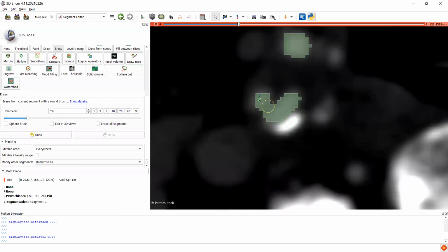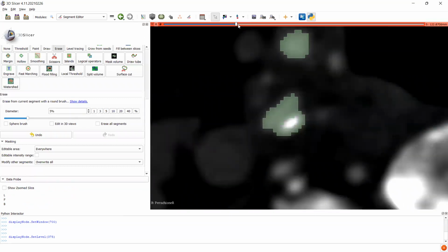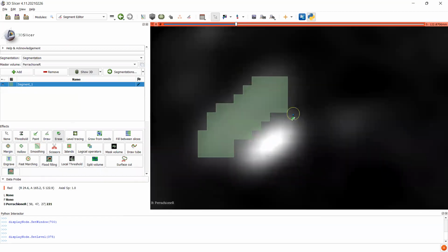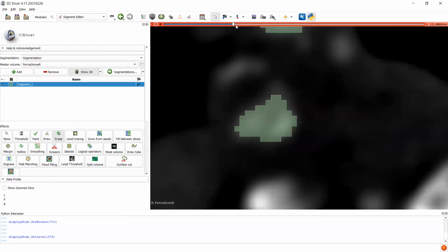And you can see right here, this part pretty much disappears, and that's fine. We're not going to segment this because that's going to create a hole, and that's a small flow channel compared to this one. This one is significantly larger. You can see here, this segment of the internal is probably why they did the operation.